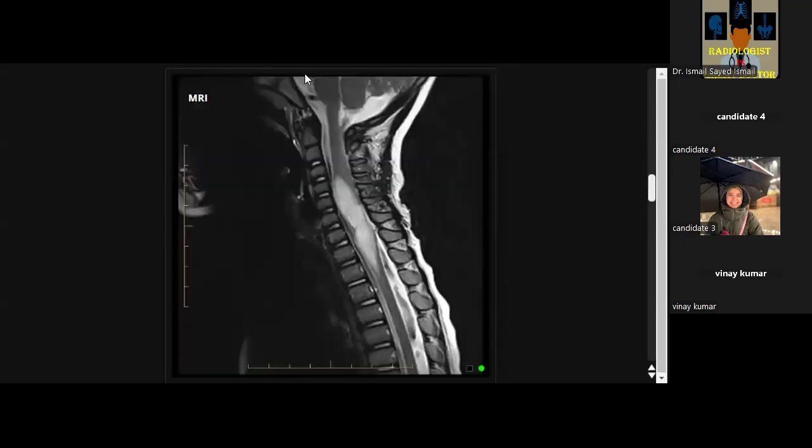And here I will look for any evidence of other gliomas, especially optic, or for other signs of neurofibromatosis 1. So for medullary lesions in the exam, describe it and try to rule out any syndromic association.